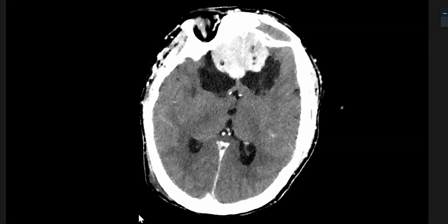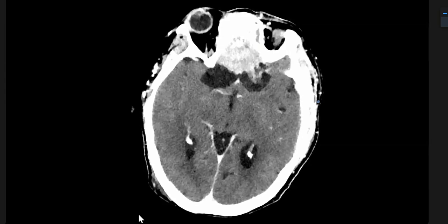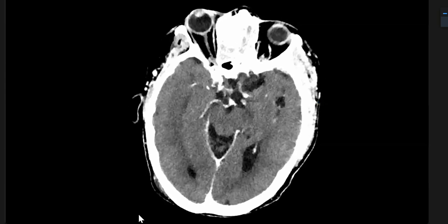Anything else you can think of here, or anything else you would like to add? Yeah, neurosurgeons would like to at least know. They are not going to get this patient from you before MRI. Yeah, so I would like to check also the MRI for this patient if available. In the interest of time. Okay.